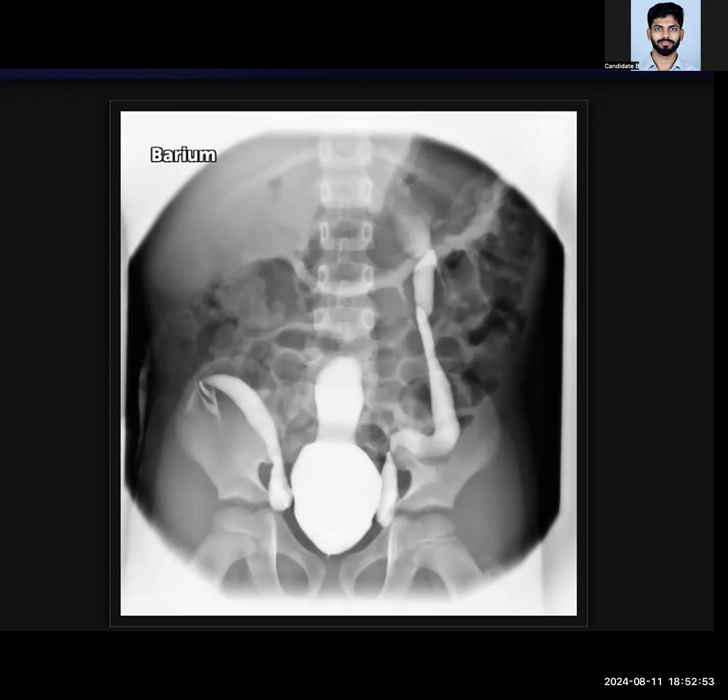So a bowel perforation with contrast extravasation and renal excretion would be another possibility. Another possibility would be a reduced caliber bowel loop, which is extending from the pelvis into the left upper quadrant.